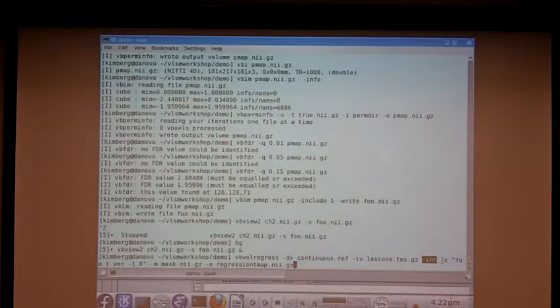And then here's the really cryptic part. This -c option tells VbVolRegress how you want to weight the different coefficients to create your statistic. So in this case, we've given it the arbitrary name foo, which I use a lot. We've said we want a t-statistic. By default, that's one-tailed. And then we're going to specify the weights as a vector, and here's our little vector of weights.